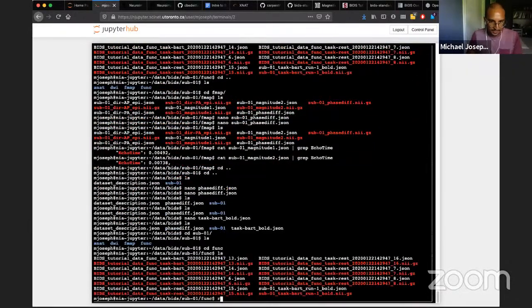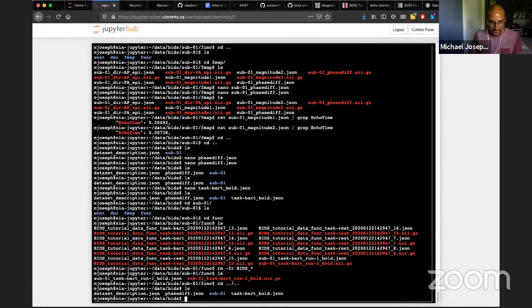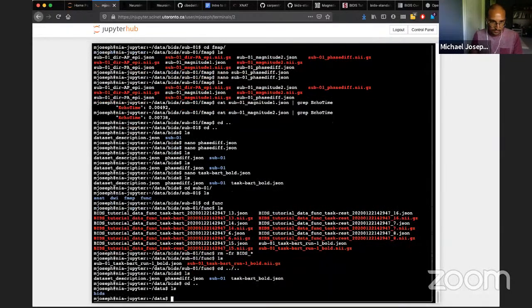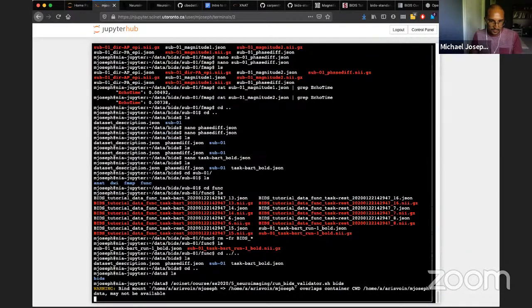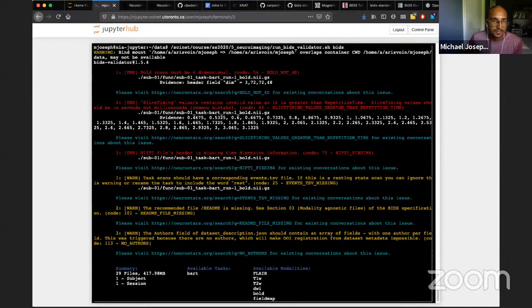I'm just going to remove all of the things that I didn't convert, so that we can test out the BIDS validator and see if what we've done so far is valid. It looks like there are a couple of problems.